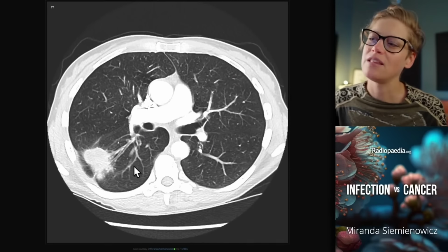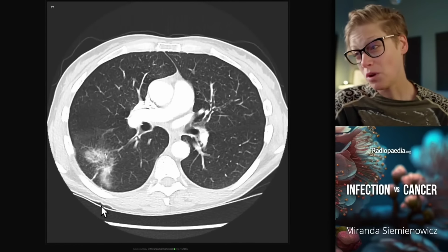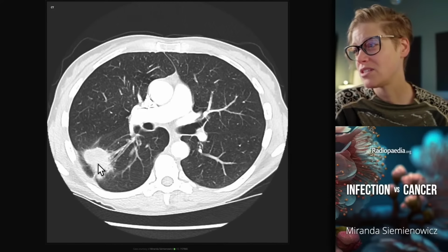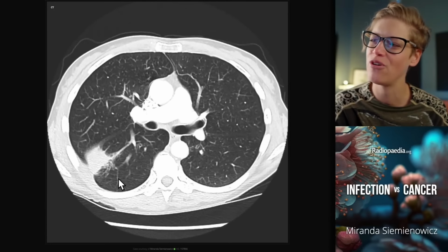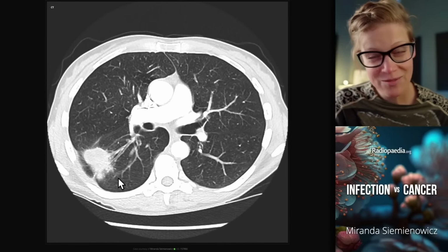So let's have a look again at this case that opened the talk, and I can scroll up and down on it for you now. What are we getting out of the lesion margins? Not very much. This is rounded. Is this a slightly ill-defined straight margin at the top? Is this a very ill-defined straight margin at the back? I don't know. But you'd never look at a fracture in just one projection.